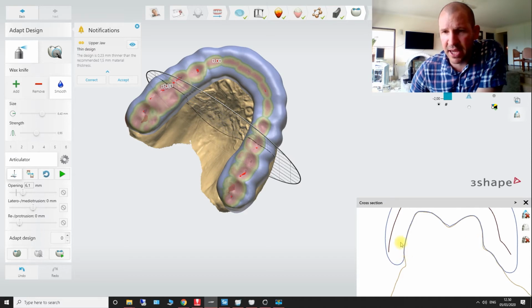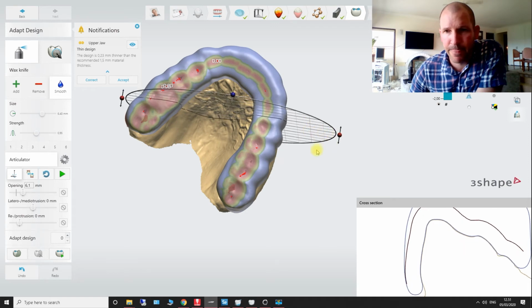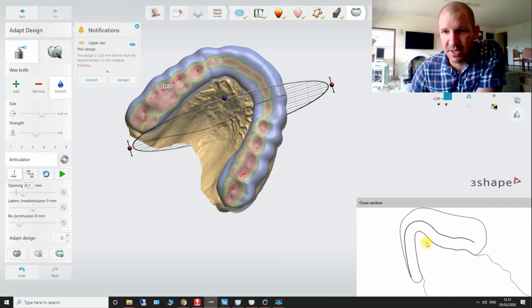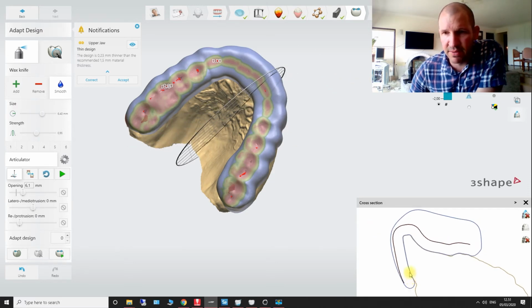So once again, just engage just enough in that undercut. Once again, just engaged enough just in there. So once again, just a little bit of undercut engagement. I say undercut so many times in this. And you can see the undercut's most probably starting about here, so it's just engaged. Once again, the undercut's starting about somewhere around here. So we're just engaged in that.